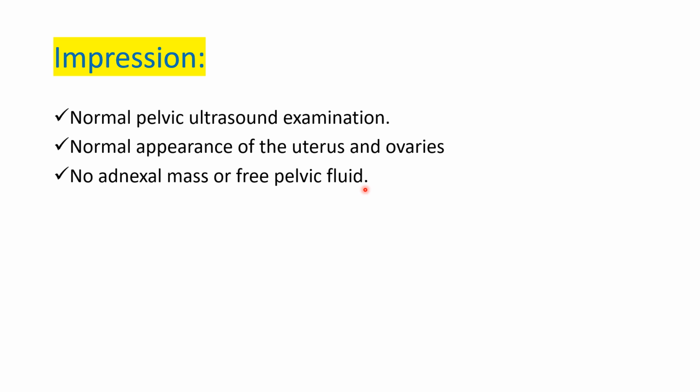This looks obvious, but it is where most people make errors or mistakes. Because if you forget to mention the pouch of Douglas, the referring clinician will have questions. Was there free fluid in the POD? Because it has implications. It can imply PID, it can imply a hemorrhage, it can imply that maybe a cyst has burst, or there's a ruptured ectopic pregnancy.